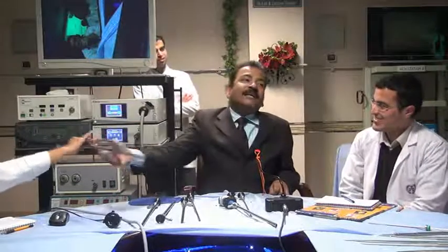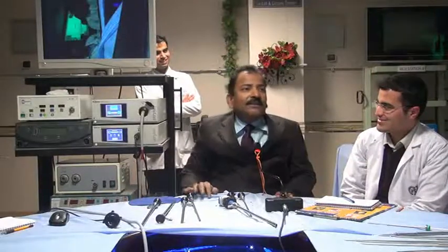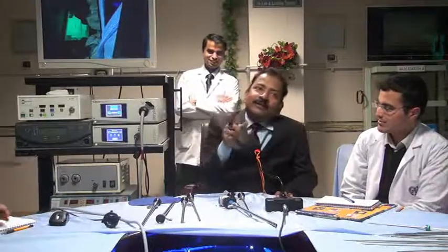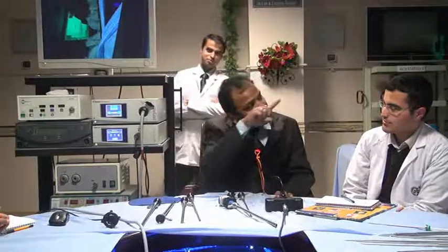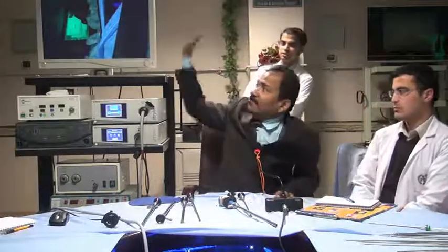But one cannot judge alone. That's why in a beauty contest they bring all the ladies on the stage at the same time. Then they can compare. If they see one today and another tomorrow, they can never decide because they will be confused. So in comparison all the other parameters should be the same: same light, same monitor, same background and quality. Now you can easily make out what the difference is.